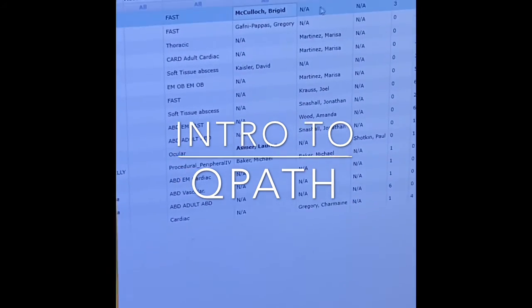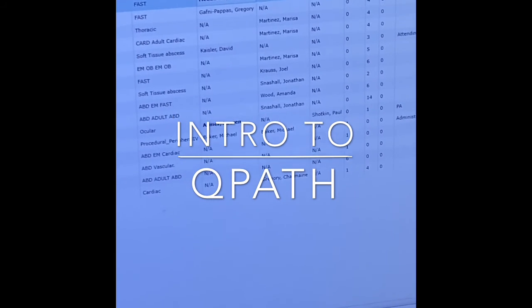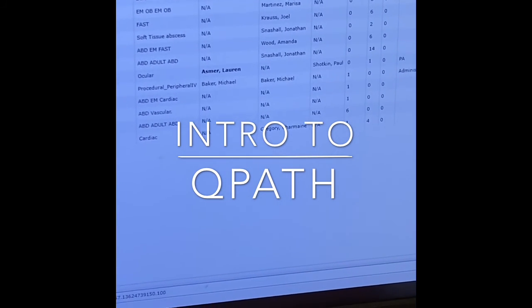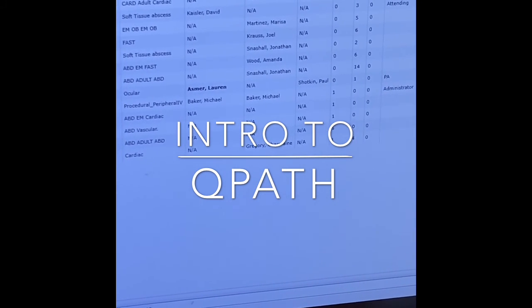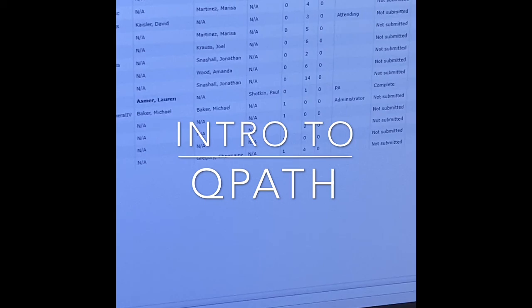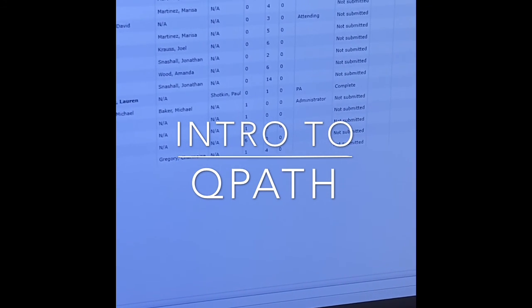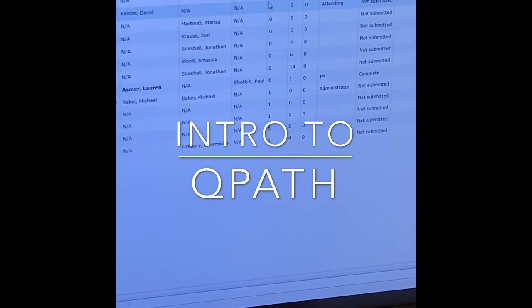The next column is the attending study. This is where the attendings will pop up when their usernames are populated in the diagnostician field in the Mindray. The next relevant column is going to be where it says images and clips. This will say how many images or clips are saved for that study.